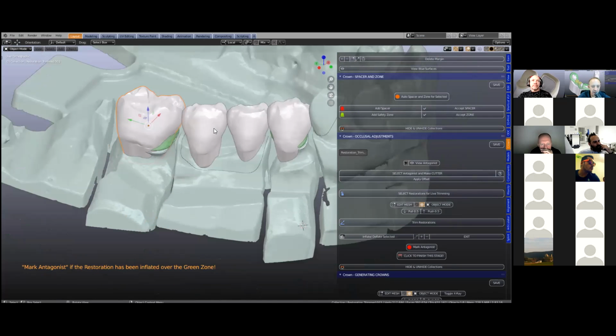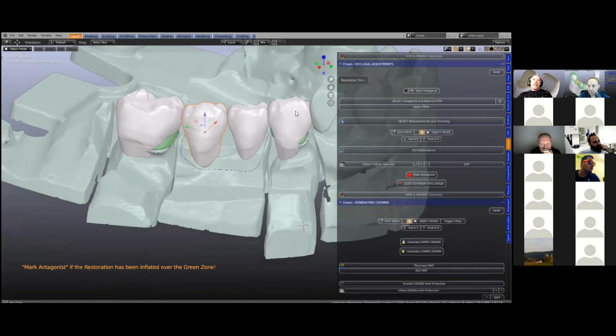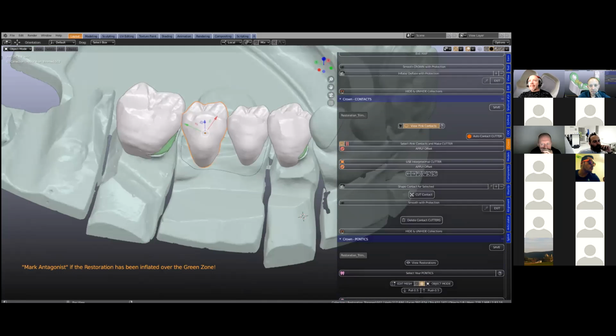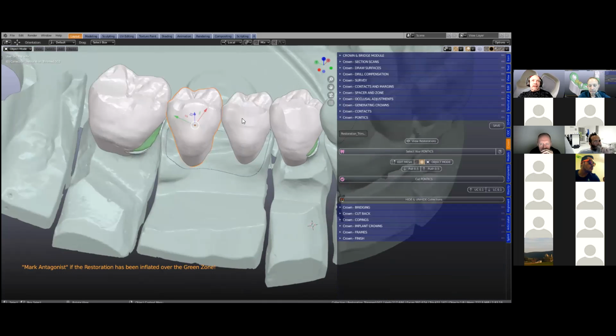Likewise, are you doing it on the other one as well, Michael? No, it's all good. I'm going to engage the Pontics now, so we'll go to the Pontic menu. Okay, we're selecting our Pontic, and we're going to click on that, and it'll say Pontic there.